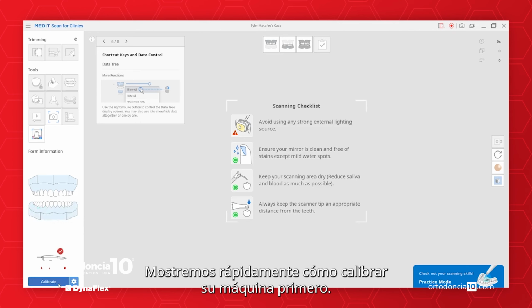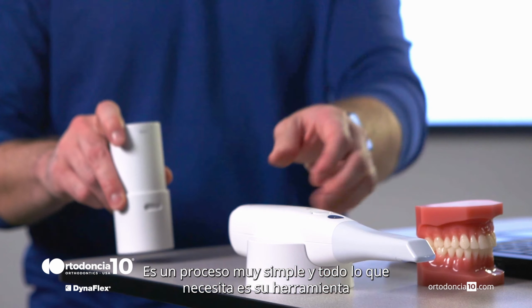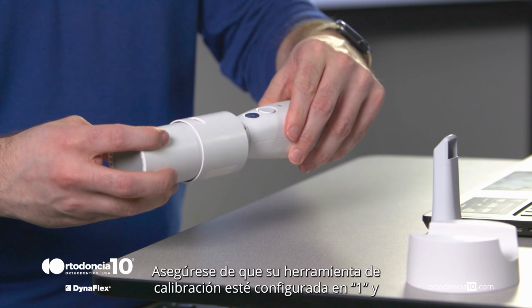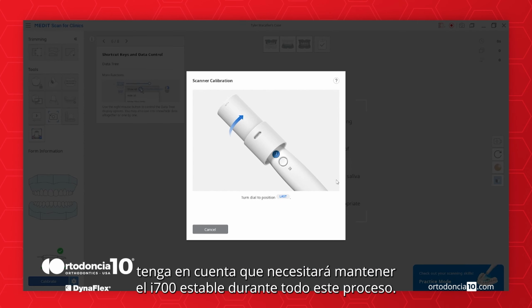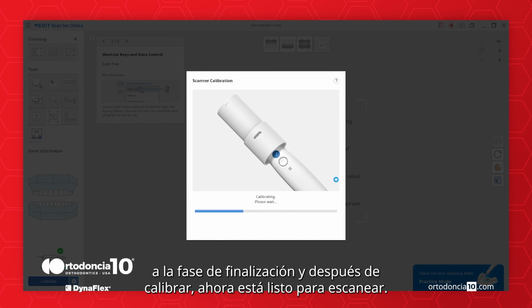Let's quickly show how to calibrate your machine first. It's a very simple process, and all you need is your calibration tool and your i700 scanner. Make sure your calibration tool is set to 1, and keep in mind that you will need to keep the i700 steady during this entire process. Follow the on-screen instructions until you reach the finishing phase, and after calibrating, you're now ready to scan.